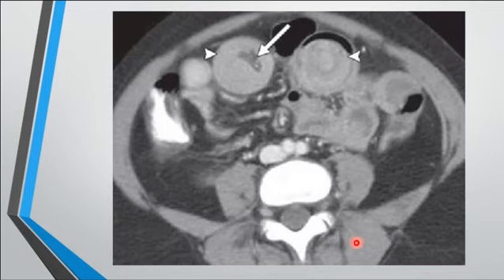So there is a hypodense area, this one, surrounded by a thickened bowel wall. So what does this indicate? And again, the same appearance here, of course, the same thing here. So there are two intussusceptions, okay? Two. This was one and this is the other one. What would you think is going on here? Why the intussusception?